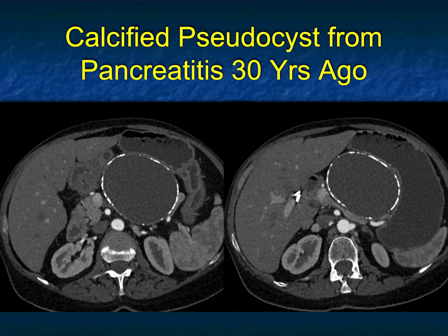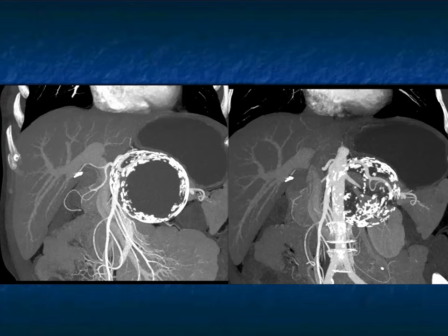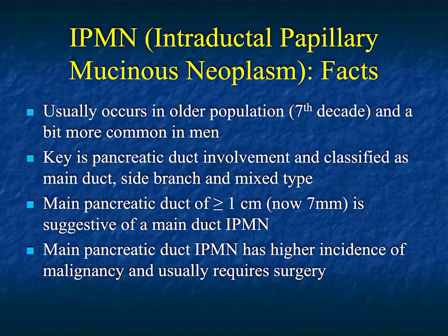Chronic pancreatitis with pseudocysts. This appearance of rim calcification, I always comment when I see rim calcification: liver, spleen, kidneys, pancreas. I always worry about old trauma, but pseudocysts, like pancreatitis, can also have that rim calcification, which you can see very nicely on the MIP imaging, kind of circumferential around the lesion. Now, we typically don't worry about pseudocysts, right? They're going to resolve. At times they don't resolve, at times they'll need to be drained, but typically that's not the problem we have, and that's not really where we're seeing all the incidental pancreatic cysts, as we've learned over time.